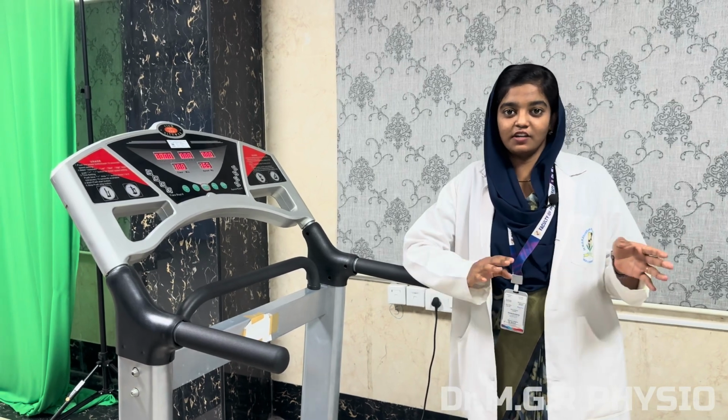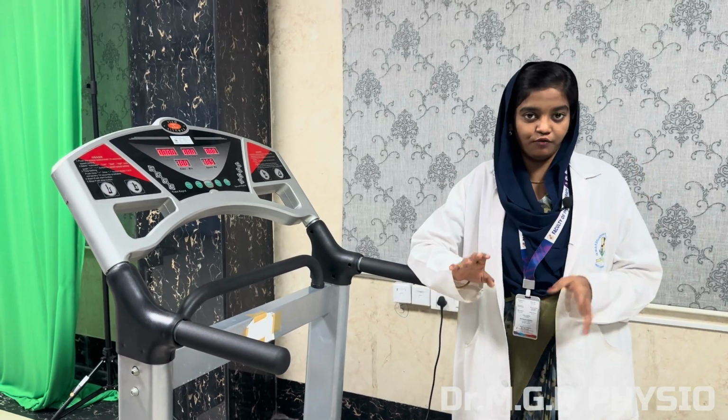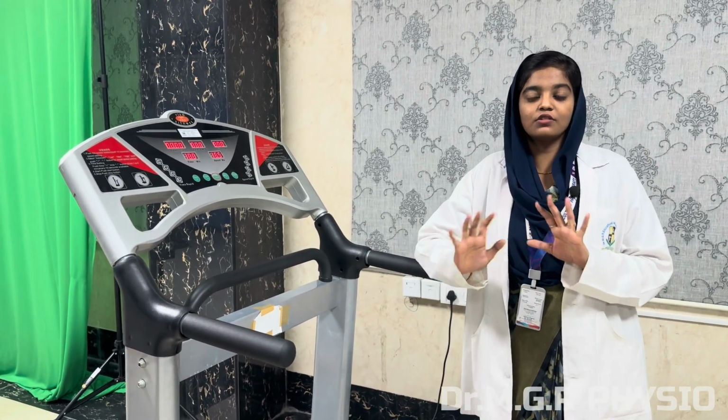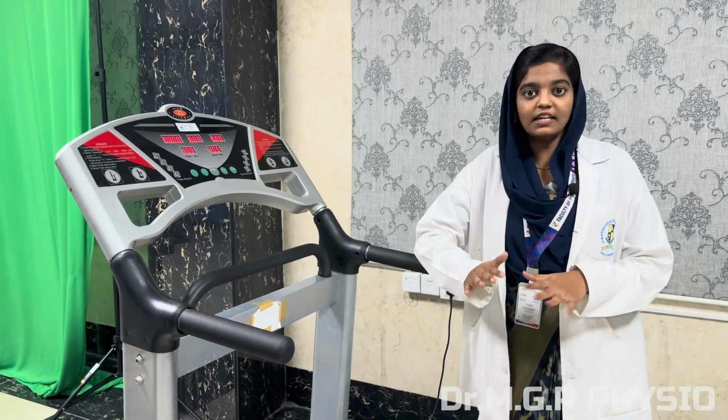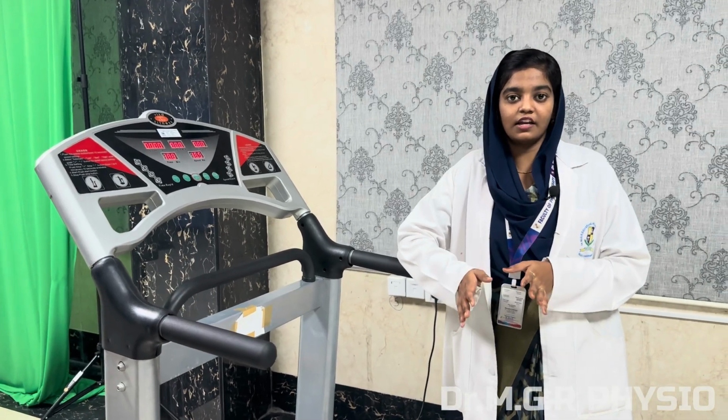The second type is the pivotal machine. Pivotal machines produce horizontal vibrations, as we saw earlier, a seesaw-like movement, back and forth. What is the importance? This kind of vibration is used for stabilizing as well as giving a rhythmic and relaxation effect to the person using the machine. The third one is the multi-directional machine, which produces a high intensity of vibrations and mainly concentrates on improving balance and coordination of the person.